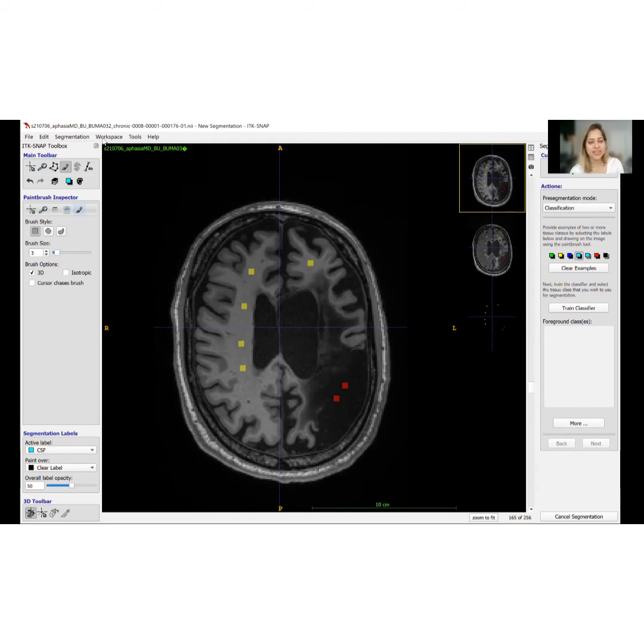It's a good place to jump in and say that we are quickly going over the labels, brushes, sizes, saving, because we are assuming that if someone wants to use the tool, you first go to the documentation and go over the 90 minutes course or whatever to understand how it works. And we are assuming by this time you already know how to use the tool, and that's why we are skipping all the fine details for what it means using different options, right? So it's just an example. Exactly.